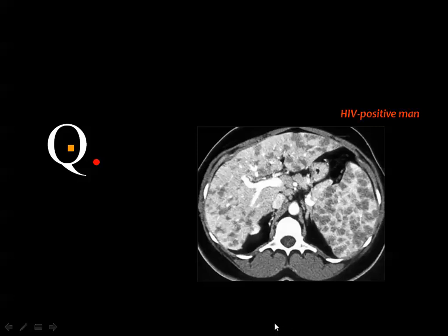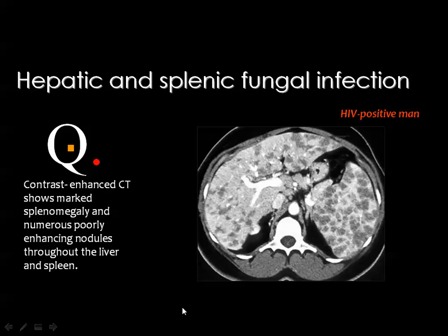And I have mentioned that whenever you are confronted by a patient with immune suppression, then you think of fungus, and the liver is not immune from fungal infection. In patients who are immune suppressed, either due to HIV or due to cancer and chemotherapy, and you get many focal lesions in the spleen, one of the best diagnoses is fungal abscesses in the liver and in the spleen. But yes, of course, I know this, and this may represent lymphoma.